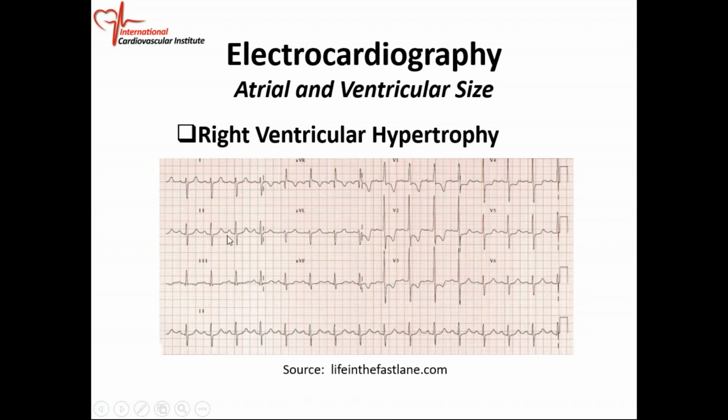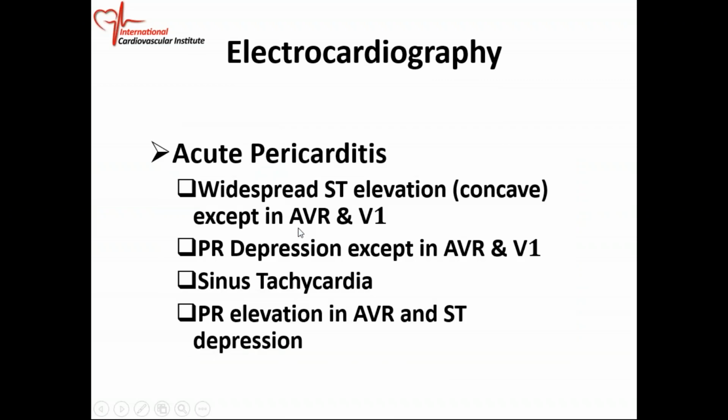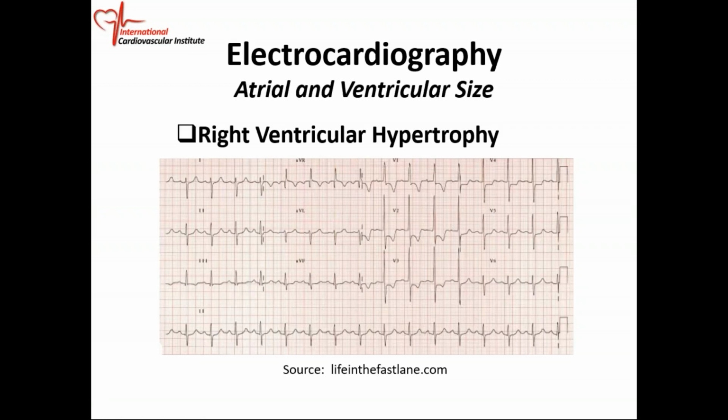So if lead 2 is the most isoelectric, that is, the positivity equals the negativity, perpendicular to lead 2 is AVL. But you can see AVL is negative. A positive AVL is minus 30. So a negative AVL is plus 150.